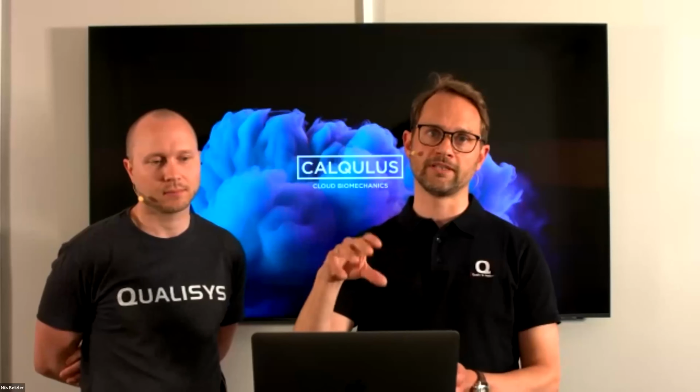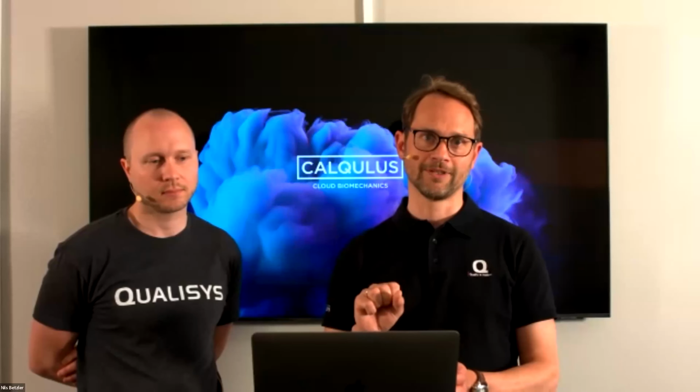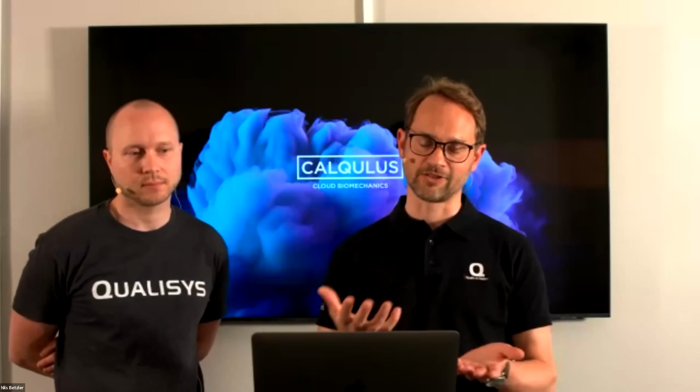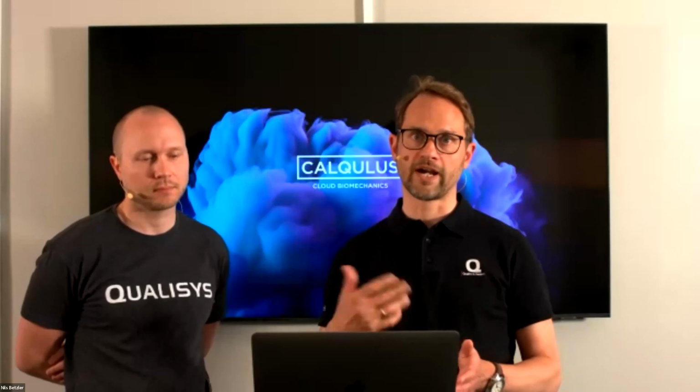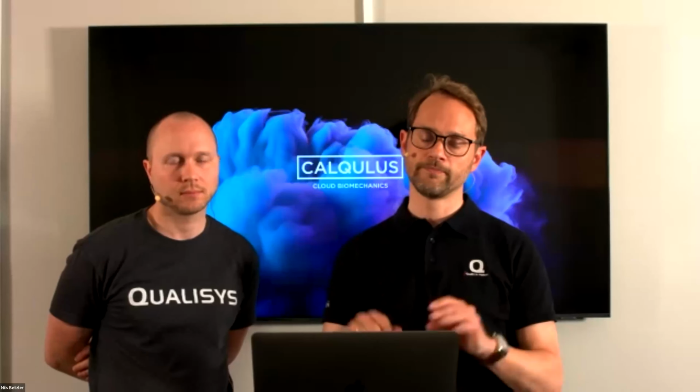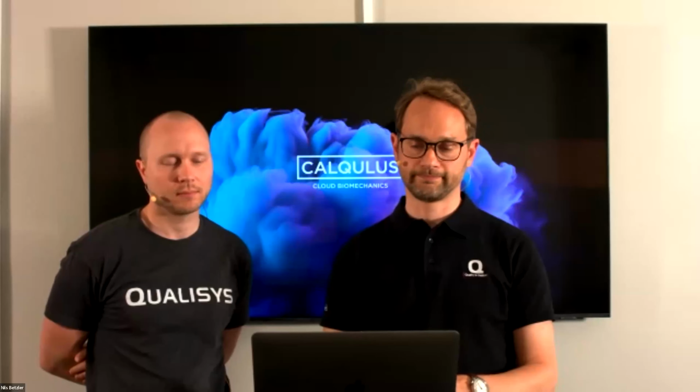If you want to make a completely brand new parameter, there will be no chart to show that parameter. So some people have managed to just reuse other charts, but that's not a good solution because then it will have the wrong name. So in the long term, we will provide that possibility as well, that you can add your own parameter or do a pipeline from scratch and then add the charts for that.